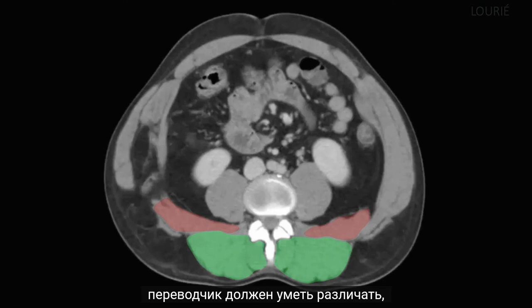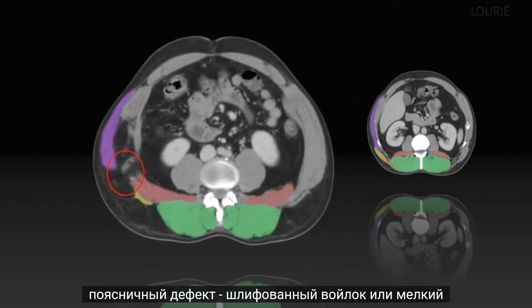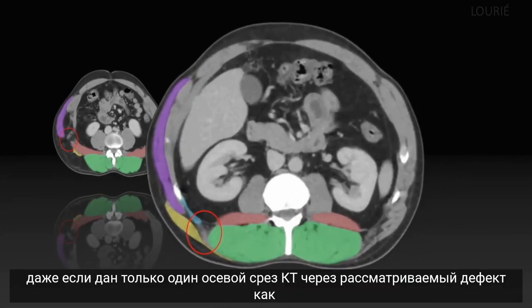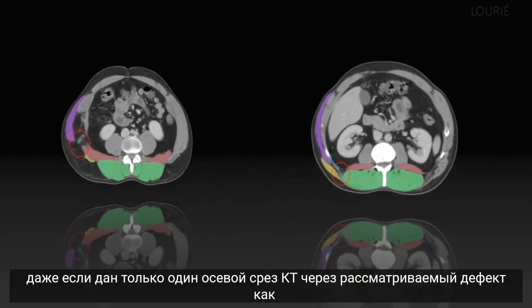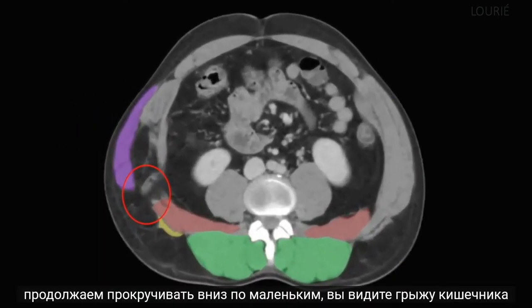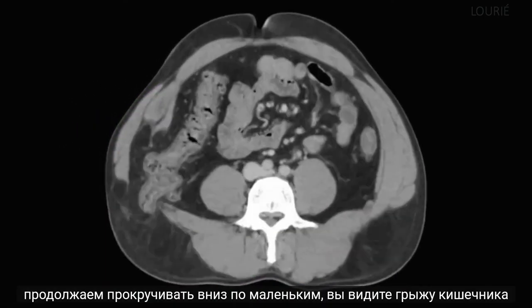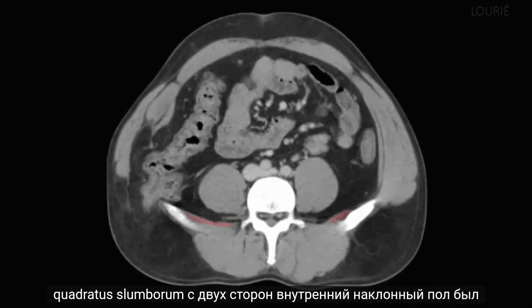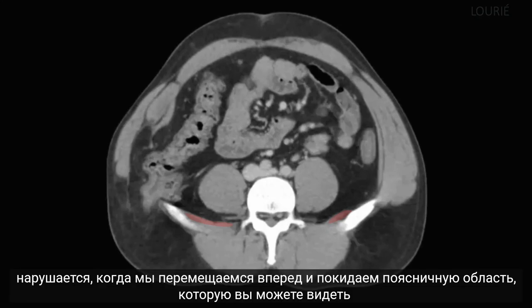Now with this insight, the interpreter should be able to distinguish whether a primary lumbar defect is a Grynfeltt or a Petit's, even if only given a single axial CT slice through the defect in question. As we continue to scroll down in the Petit's, you can see the bowel herniating with contact with the iliac crest. You see the last bits of attachments of the quadratus lumborum bilaterally. The internal oblique floor has been disrupted.